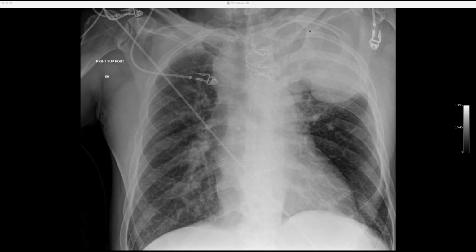You can see there's obviously not really an apical cap, maybe an apical, what do they call those giant bearskin things that the Napoleon soldiers used to wear? A very large extrapleural hematoma, but also right paratracheal stripe thickening. He's had some previous heart surgery. It looks like a CABG there with a little clip and some LIMA clips.